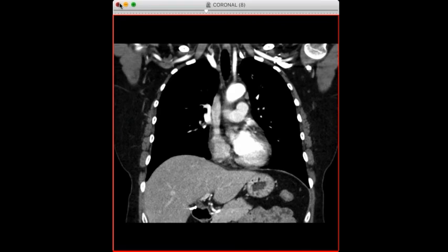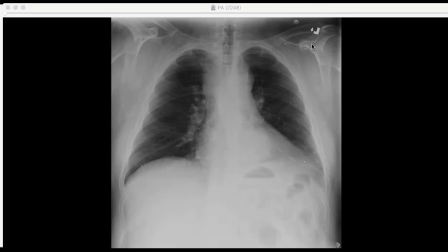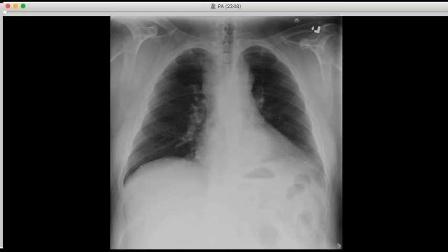Okay, and then this is an interesting case I saw this weekend. Let me bring up the radiograph here, show you. So this is a patient who presented with sort of some vague back pain. And you know, the history changed depending on which body part they were imaging. But the bottom line is he was having some back pain.